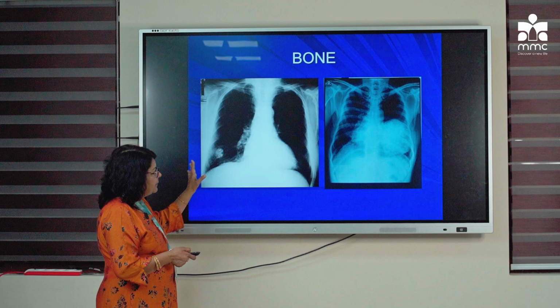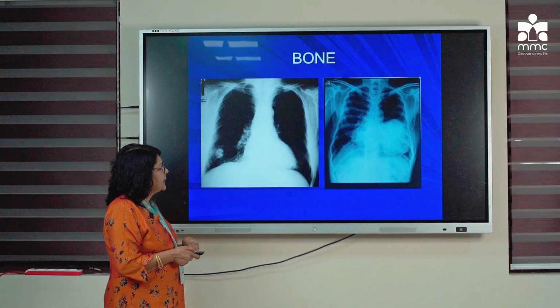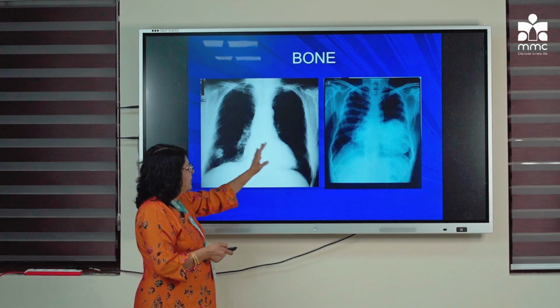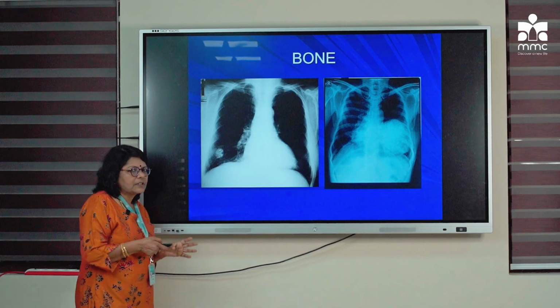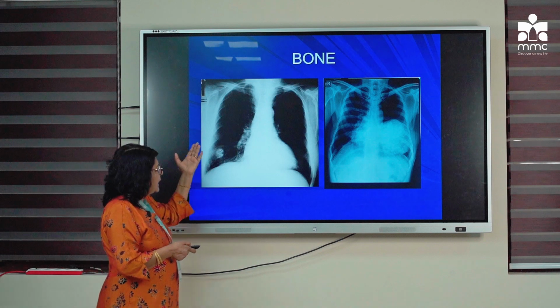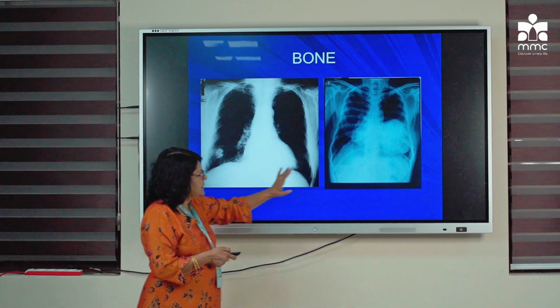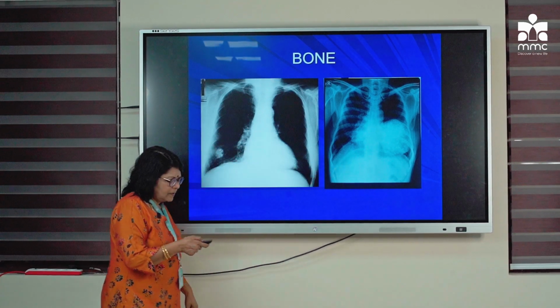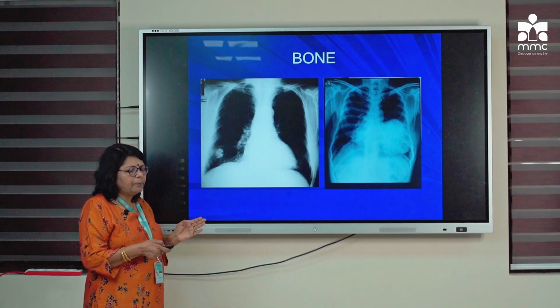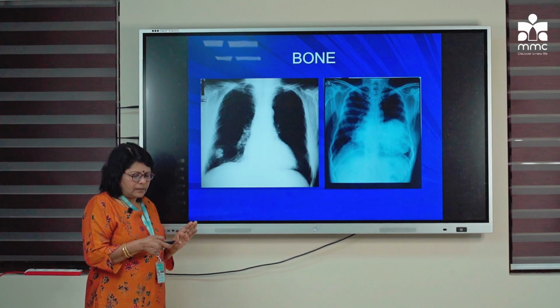The bone. The lung and the heart are protected by the chest cage, the thoracic cage, mainly by the ribs, the clavicle, the sternum anteriorly and the vertebral column posteriorly. Any pathological lesions containing bone-containing structures are called hamartoma, or there can be pathologies like metastasis which can calcify. A small hamartoma has calcific densities; a large pulmonary hamartoma is called a giant hamartoma with calcific densities. So they can appear bony on a chest X-ray. Bone also appears white, but densely white.